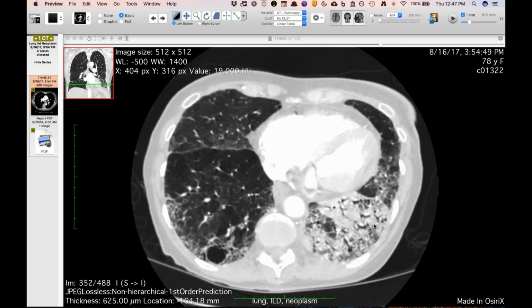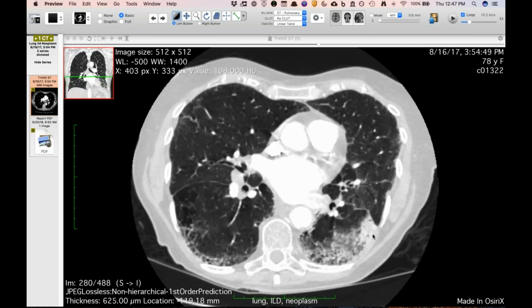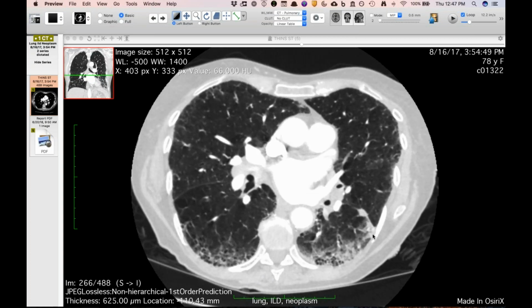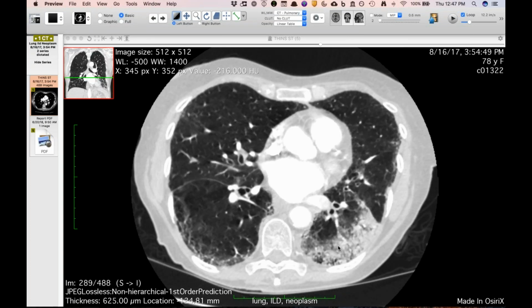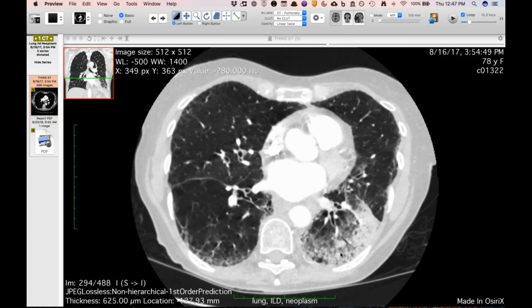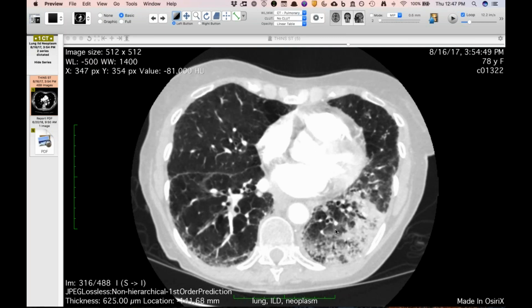I think it's more of a mucinous component with the ground glass and consolidation. She does have some underlying fibrosis, but we've seen other cases where it has been mistaken for fibrosis when you have asymmetry, as these adenocarcinomas can cavitate or cause architectural distortion.